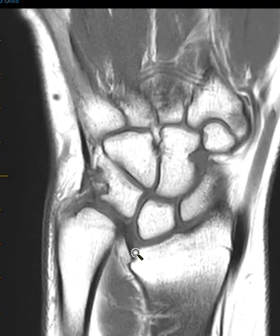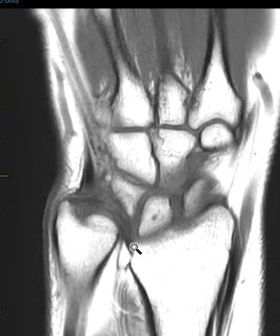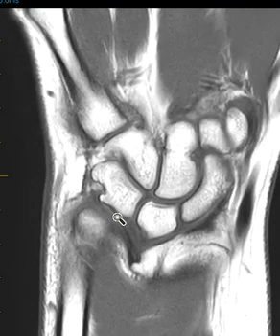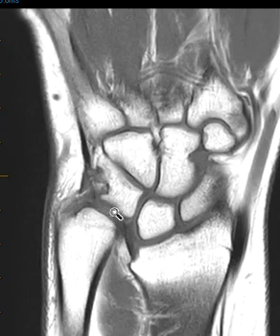And in this space, the triangular fibrocartilage, a little fibrocartilaginous band, fits through there, so they get impaction or abutment between the ulna and the triquetral bone. We call it ulnotriquetral impaction, and they can get associated tears of the triangular fibrocartilage. This patient has some degenerative signal there, but I did not see a definite tear. The other thing these people get is proximal migration of the carpal bones. So especially this bone here, the lunate bone, migrates proximally because the radius is so short.